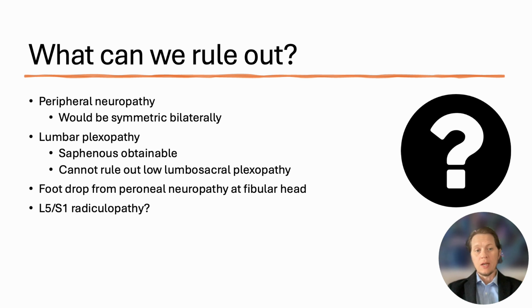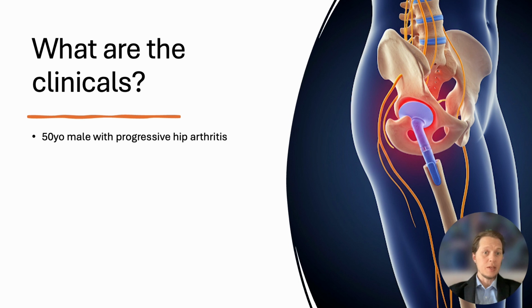What about foot drop, right? Well, there's no decreased conduction across the fibular head, so we shouldn't really call that. And what about an L5 S1? Can we rule that out? Well, not yet. So maybe this is a boring case of just an L5 and an S1 radiculopathy.